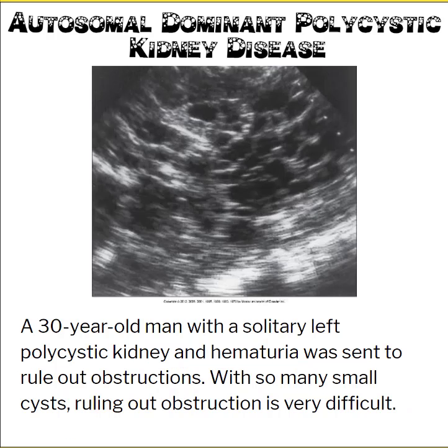Here's another example of actually a younger person with polycystic kidney disease. Again, just tiny cysts scattered throughout the area that we would expect the kidney to be in. We don't see any true renal sinus or renal parenchyma, but what we can see is a bunch of cysts in the area. And then another close-up of a kidney just showing a bunch of cysts.